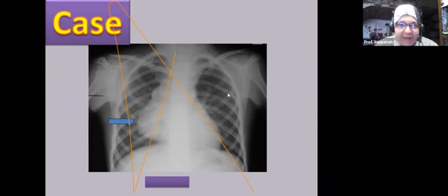Okay, is this a teratoma? Well, we have nothing to say it's a teratoma because radiologically, we don't see any calcification. Is this a lymphoma? We have a single lesion. We don't have a superior mediastinal mass and we don't have generalized lymphadenopathy. We have only a single lesion. So we cannot say this is a lymphoma. So by exclusion, we can say this is a thymoma.